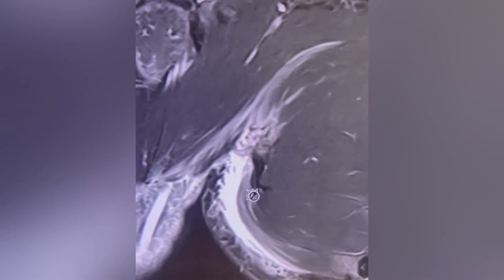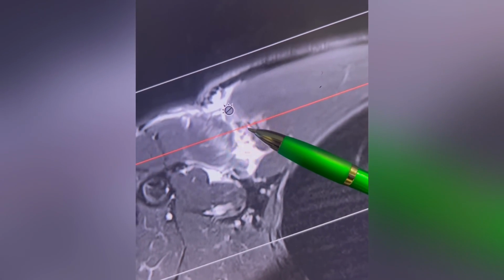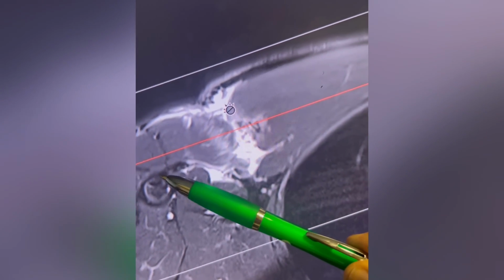Oftentimes patients are told that these are not repairable tears. Well, they're actually not repairable, but they are reconstructible. So if you're going to have this type of tear treated, myotendinous tear, the surgeon has to be prepared to use cadaver tissue, also known as allograft, because without allograft, this portion of the muscle will not be pulled enough to reach the bone, and that's why we use allograft for these.